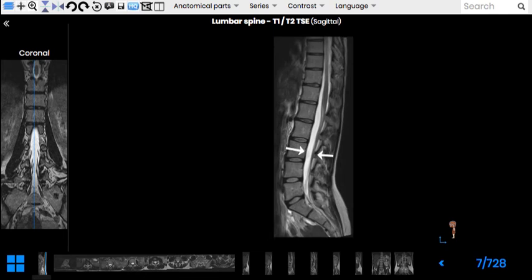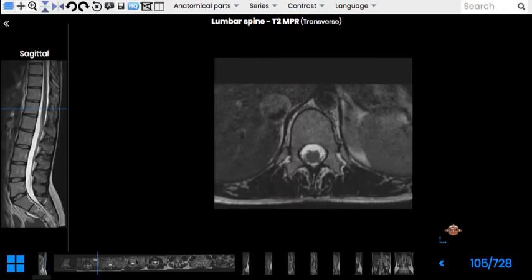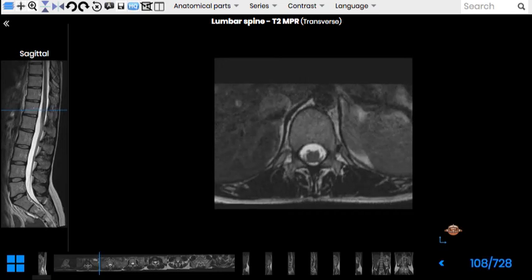By the way, the distance between the posterior surface of the vertebral body and the vertebral arch is quite important, as it shows us whether there is enough space for the cauda equina and for the conus medullaris or not. It normally must be 15 to 20 millimeters. These are the normal parameters, but if it is narrower, like 13 or 11 millimeters, we can consider the diagnosis of lumbar spinal stenosis.